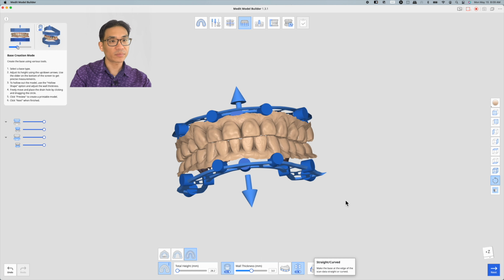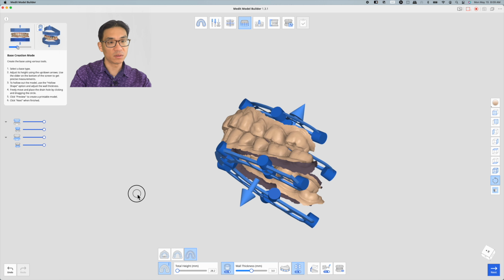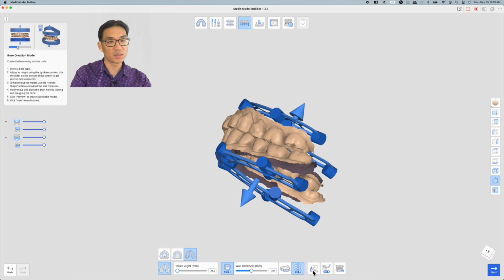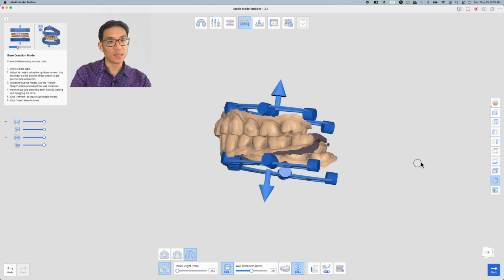You can even, at the distal ends of the model, add it to make a base so that if you're printing vertically, that's nice and flat for you, so it's easier to print. And then you can also even add a bevel.